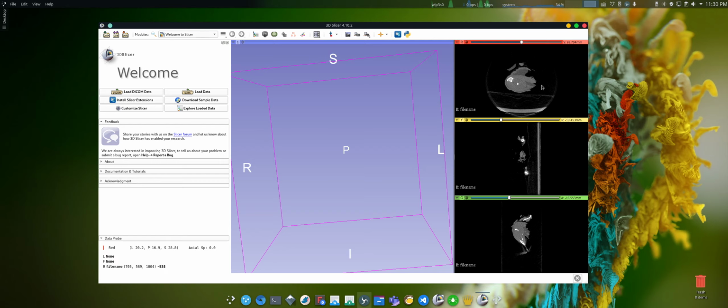As you can see, the majority of the image contains the area outside the limb that we are trying to analyze. Therefore the best idea is first to crop the image. By cropping I mean focusing on the tissue and bones, and removing everything outside the organ of interest.